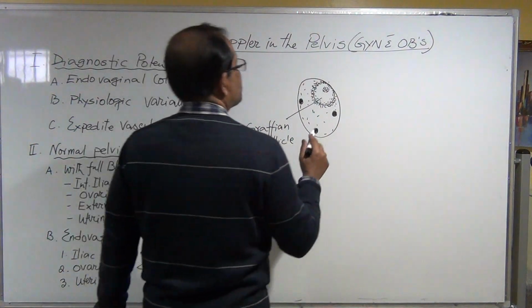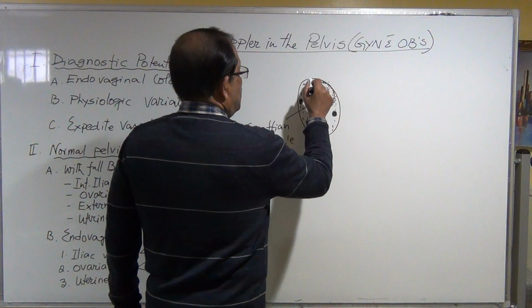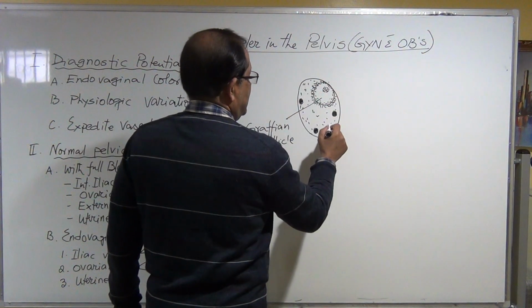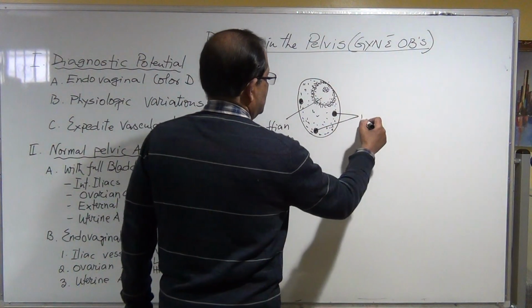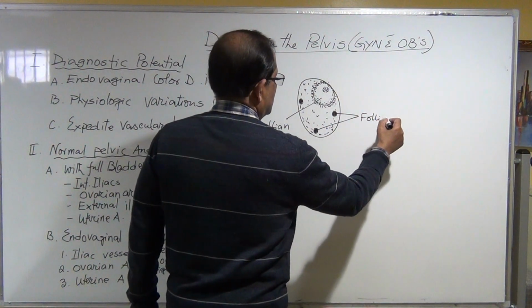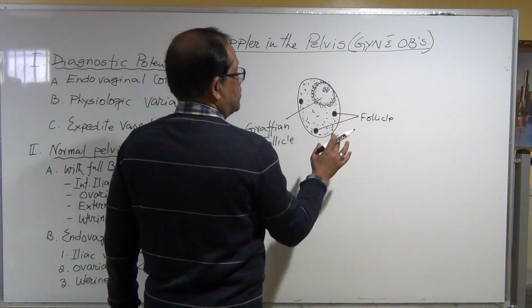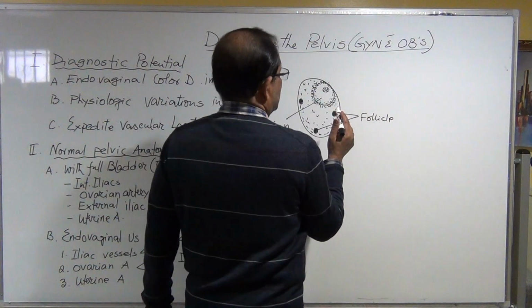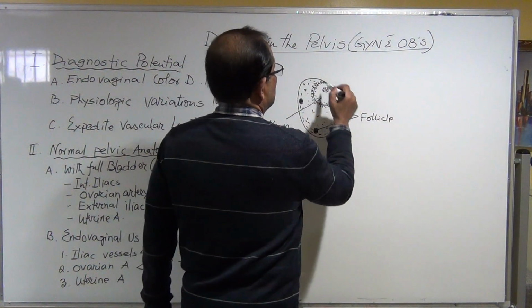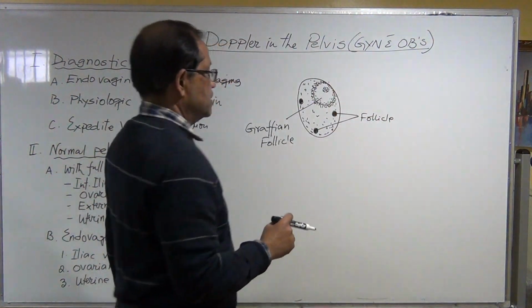Okay, so now when this ovary has ovulation, these are follicles that did not take part in the Graafian follicle; they did not grow. Okay, so now this is the Graafian follicle, and the Graafian follicle has cells around it.